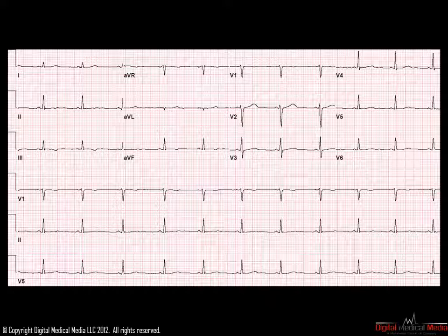In the past, this particular ECG was thought to represent a clinical syndrome called Lown-Ganong-Levine. This syndrome was thought to be caused by the presence of James fibers, which were extra electrical connections that were theorized to connect between the atrium and the His bundle directly, bypassing the AV node. In bypassing the AV node, they also bypassed its decremental conduction properties, therefore eliminating the PR segment from the tracing. We have since discovered that Lown-Ganong-Levine is a highly questionable syndrome and is likely to exist only rarely, if ever at all.